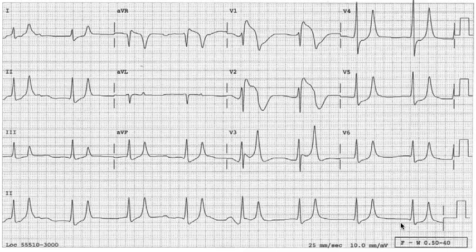As the potassium levels increase, most of the cells in the atrial myocardium will be inexcitable. So the electrical signal from the sinoatrial node cannot excite the cells in the atrial myocardium. So the P waves get flatter, flatter, flatter as the potassium levels increase until you see disappearance of P waves.